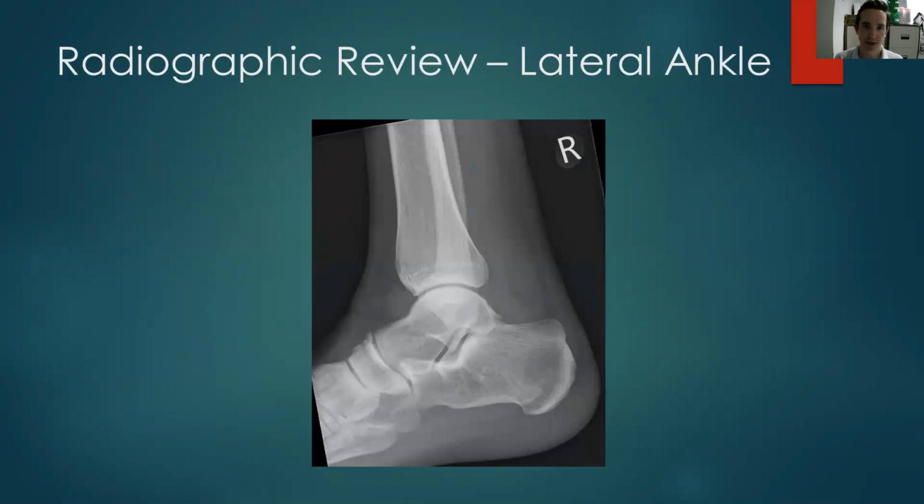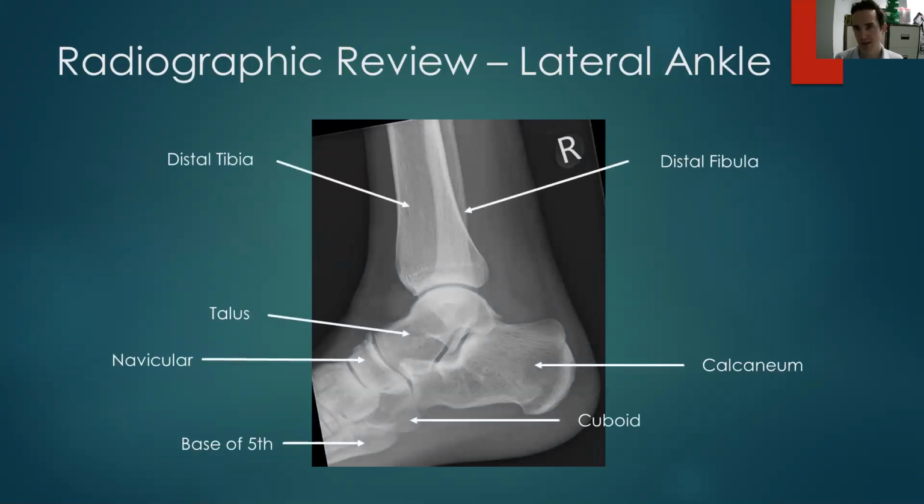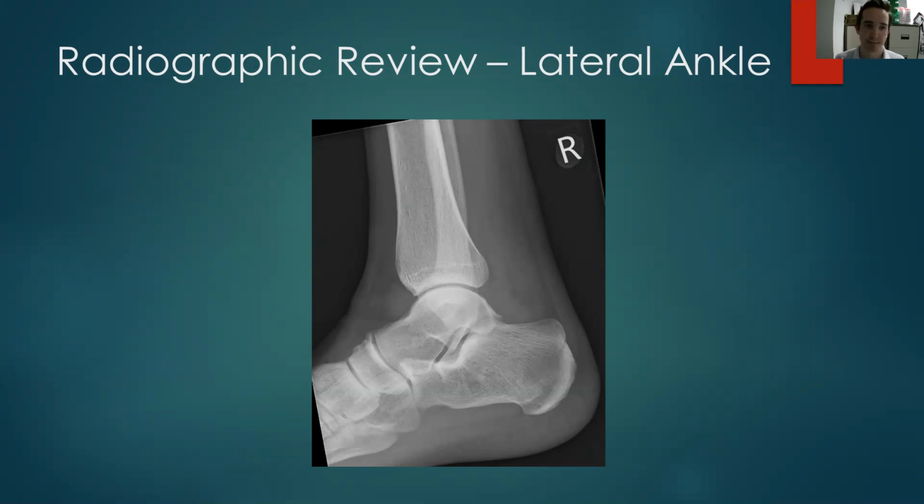Now to the lateral view, and again, here's the basic anatomy. I'm not really going to bother delving into that. Bear in mind the base of fifth metatarsal, obviously. That should be visible on the lateral view, and it's always a nice place to check for an unsuspected fracture.